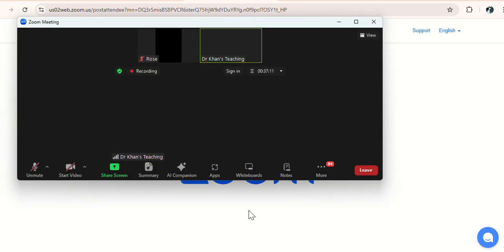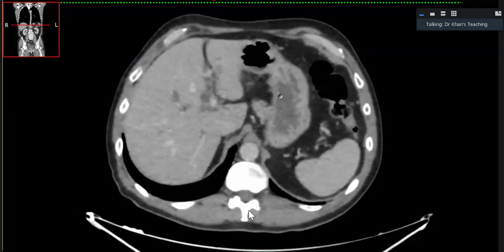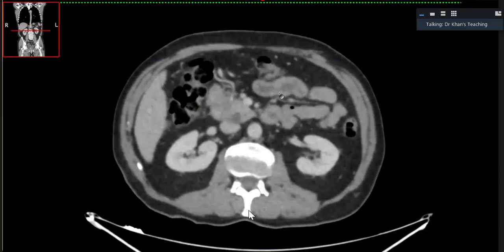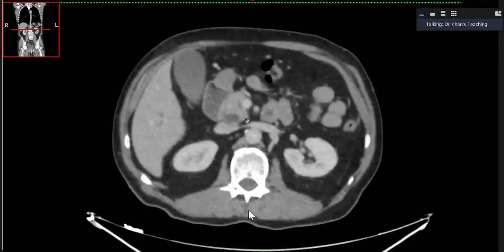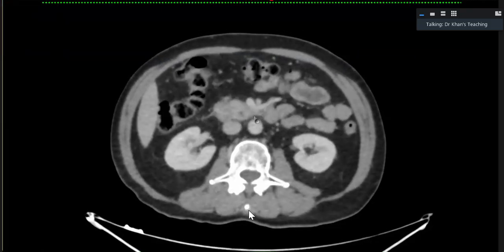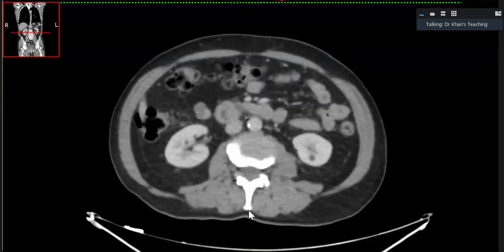So I will show you the procedure, because that per se can also be an exam case, but this is how the patient presented initially. The patient presented initially with, this CBD is dilated, and this CBD goes till the ampulla. Interestingly, pancreatic duct is not dilated, so double duct sign is negative. Usually we see it in malignancy.